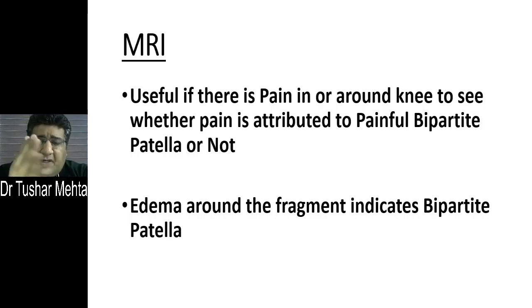Actually, what happened, I'll tell you, there was a fibrocartilaginous bar, as I told you, that got disrupted because of that injury. Now, that was the reason for the persistent knee pain. So I could see the edema, and the radiologist could confirm the edema around the accessory fragment and the main patella fragment. So he said that there is not edema around the patella, there is edema within the patella. I said, why? What are you saying? He said there is edema within the two fragments of the patella, the main and the accessory fragment.